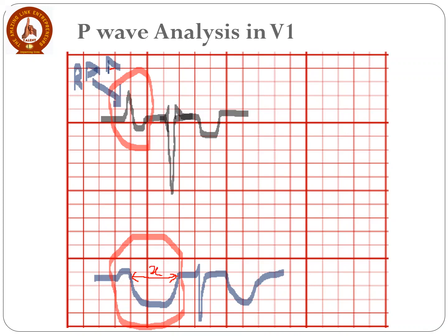Then we also look at the depth, which is y. So we get the product, the P-terminal force, which is the product of x and y.